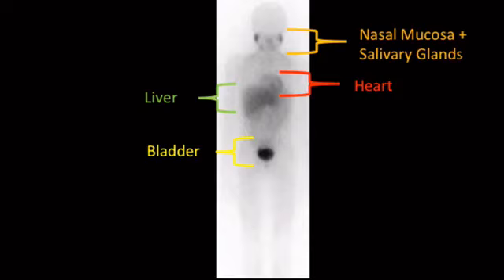Now, what they may do, and I'll talk about this some more later, is bones. You should never see bones with MIBG. Never. That's not normal. Not normal to see bones, okay? No bones. Remember, that was step 1. No bones.